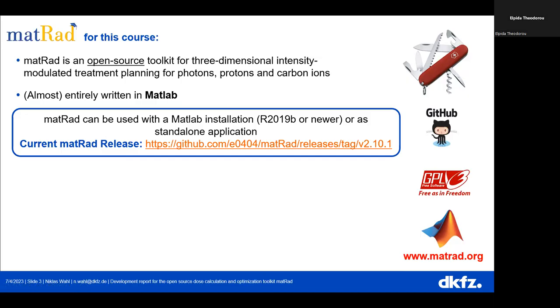Some of you, I guess this will be the minority, might have a MATLAB installation on their computer. Maybe you are students, and maybe you worked with MATLAB in one of your projects. Even if you are already professionals, you might still have something.